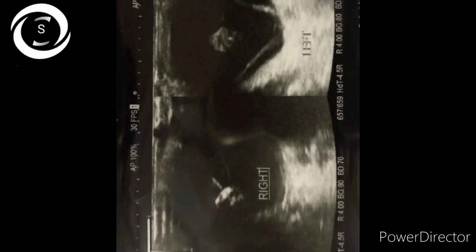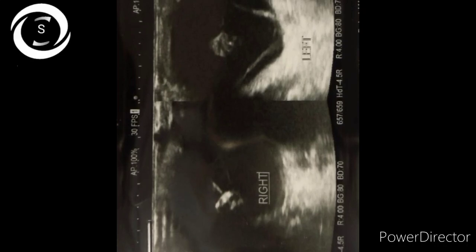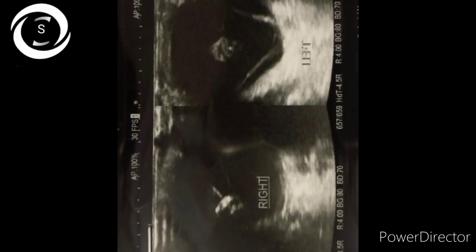So let's solve the challenging case 154. Now in this challenging case, I presented an ophthalmic investigation and asked a few questions. Now what were the questions? What is this investigation? So it is a B scan ultrasound of the eye, in fact both eyes.